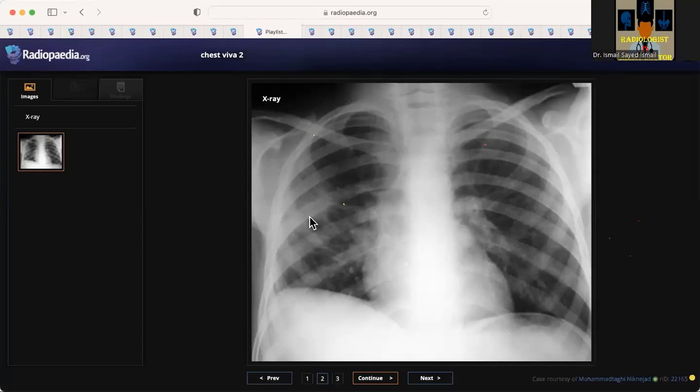Maybe the horizontal fissure is slightly outlined, and also mild blunting seen at the right costophrenic angle. Okay, so cause more with infection. If I tell you the right costophrenic angle looks okay, what do you think about this hemidiaphragm? So it could be subpulmonic effusion. Yes, so subpulmonic.